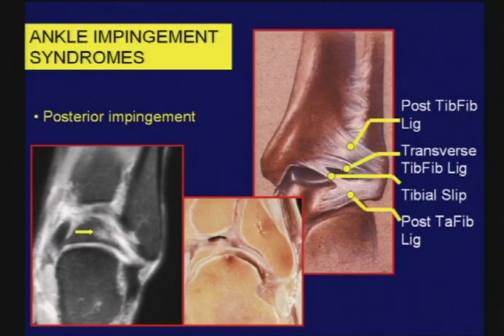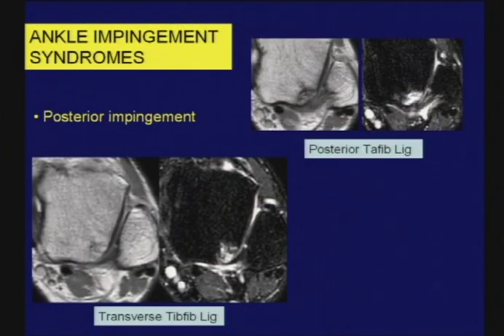Now this, of course, could be related to acute injury, but I'm talking about patients who have had no acute injury but present with thickened ligaments. Here, for example, a patient, again, who clinically was touted as having posterolateral impingement. I show you two levels on these axial images.